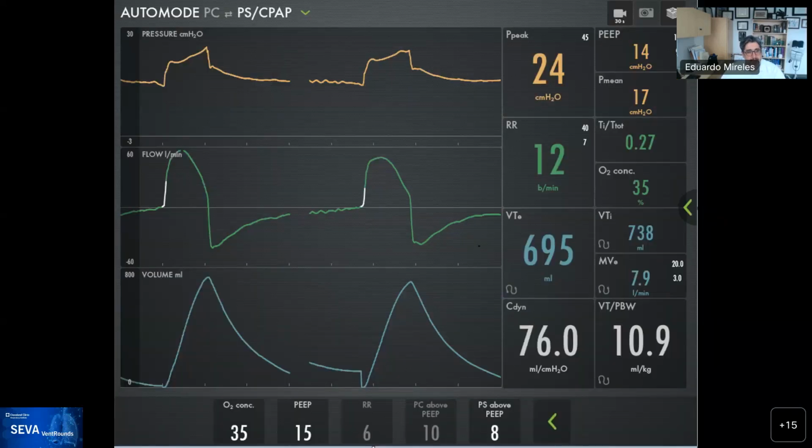And we dropped further the respiratory rate, and to us, a big part of this behavior, what we call reverse trigger, because each breath was having this, is a manifestation of the effect of sedatives and opiates in the respiratory centers of the medulla and the bulbar area.